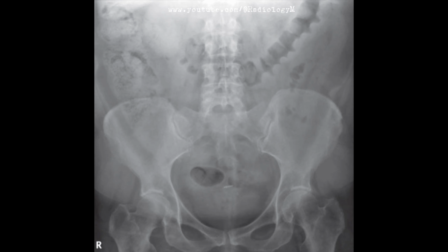Given these imaging findings, my primary diagnosis is ulcerative colitis, particularly in an active inflammatory phase, as indicated by the thumbprinting. Crohn's disease is less likely due to the continuous nature of the bowel involvement and the absence of skip lesions.